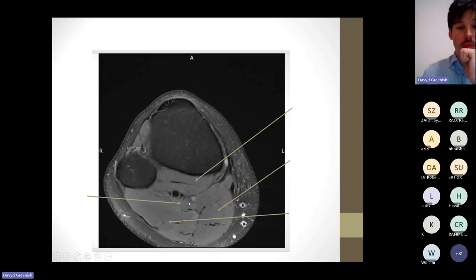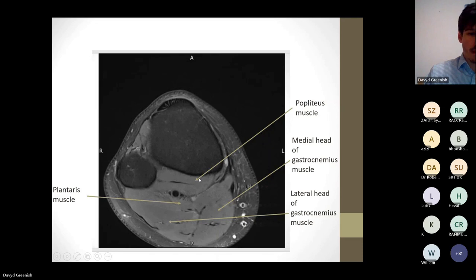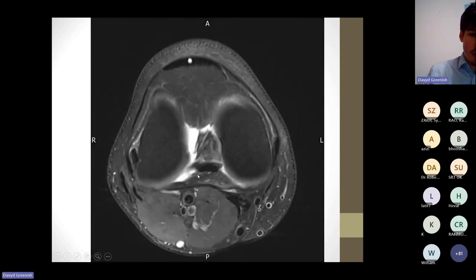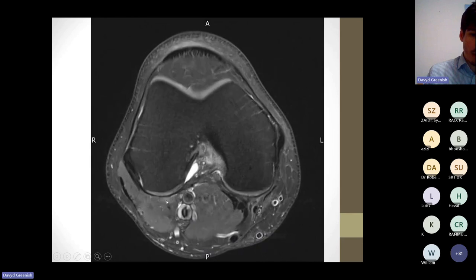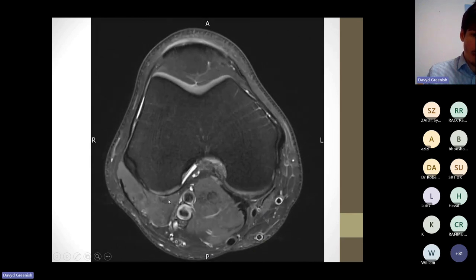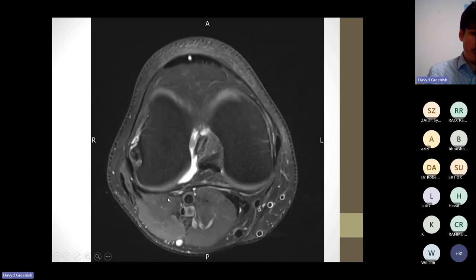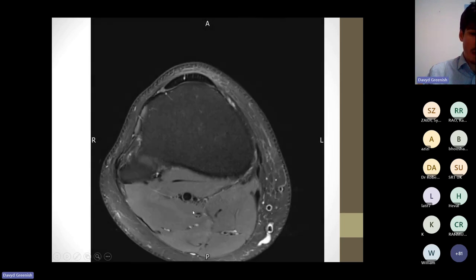This is getting to absolutely crazy, crazy difficult levels. Yes, perfect. So plantaris muscle, spot on. And then this muscle here started more laterally and is traveling down. It started in that popliteus groove, traveling down. So this is the popliteus muscle. Yeah, nice. This is just to quickly try to convince you that we have got the plantaris muscle here. It's arising just deep to the lateral head of the gastrocnemius, and it travels more medially here.